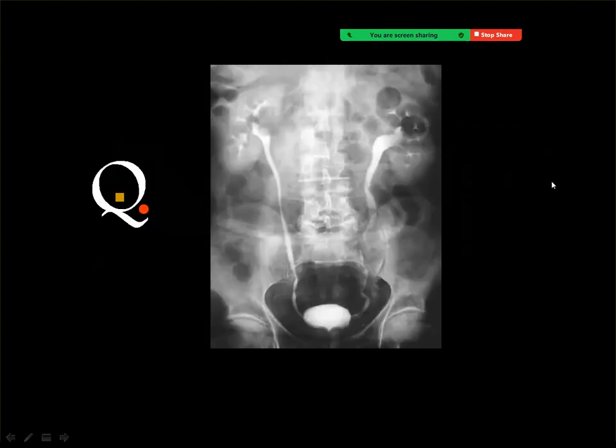This is a selected film from an intravenous urograph.